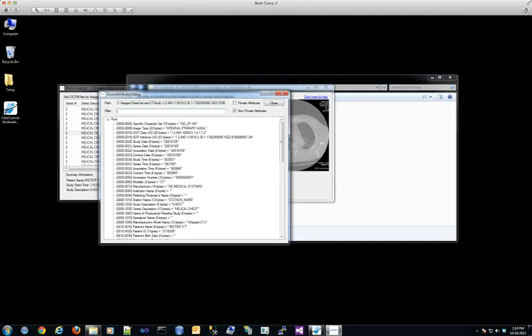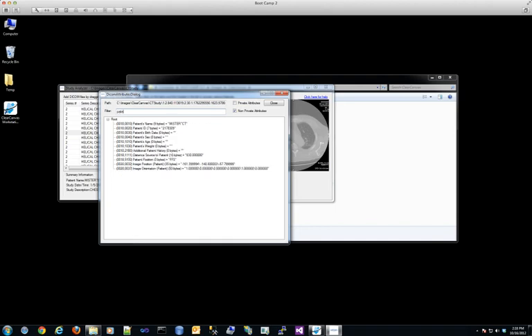A file may have a large number of attributes and it can be difficult to find one sometimes in the list here. So we have a capability to filter the list down very rapidly. For example, if I want to find the patient ID, I just start typing in patient up here, and it whittles down the list of attributes by what I've typed in. If I keep on typing, patient ID, it's actually just showing the patient ID here. So that's a really quick way of finding specific elements in the large number of attributes that are displayed.